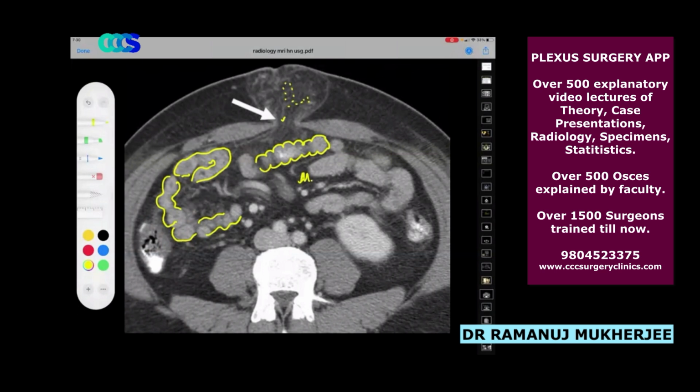So what can this thing be? Omentum. Fat. Okay. Is it viable or is it not viable? What is your opinion? Viable. Why did you say it is viable, sir? Due to the enhancement.